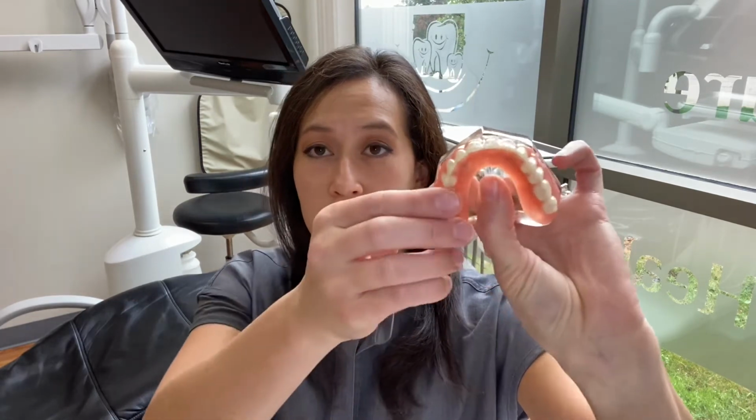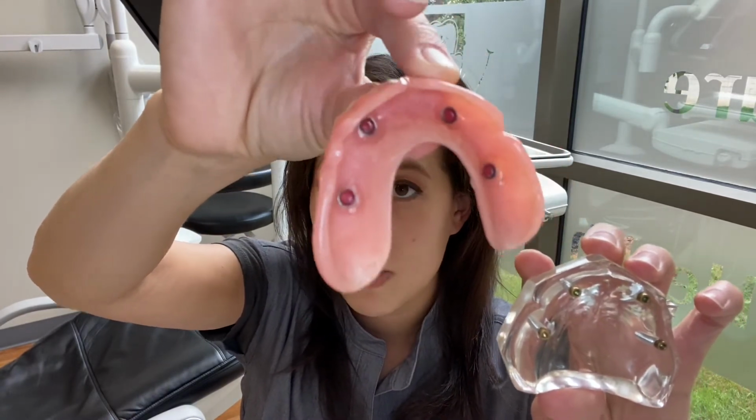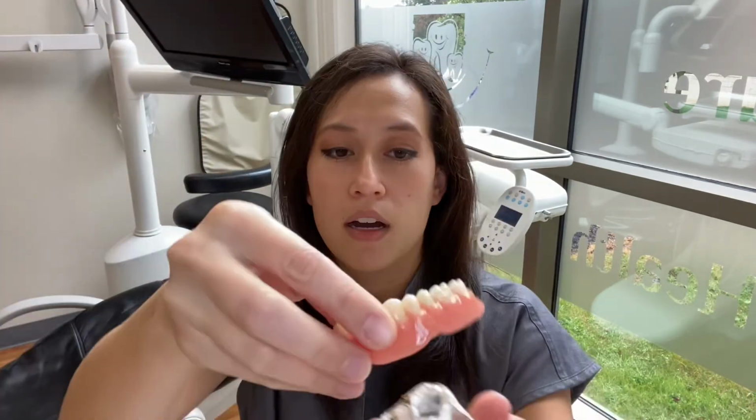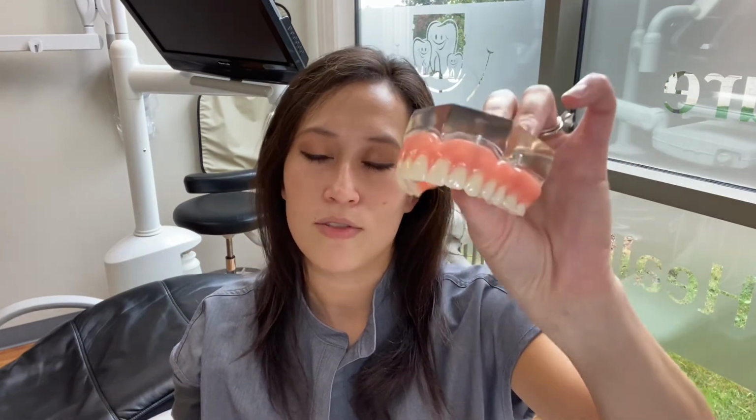So for example, now in this model, they have the roof of the mouth hollowed out in a U shape. But for the sake of just showing you how this connects to the implants, we put special abutments or connectors on top of those implants. And there's a partner that actually snaps into those attachments. So this is an example of what we call a locator attachment. Those locators, when we place the denture on top of those implants, those attachments, you can hear it kind of snap or click in, and this helps to not only retain the denture but semi-support the denture. Dentures in general are also tissue bound or tissue supported, so you're kind of relying on both factors with that.